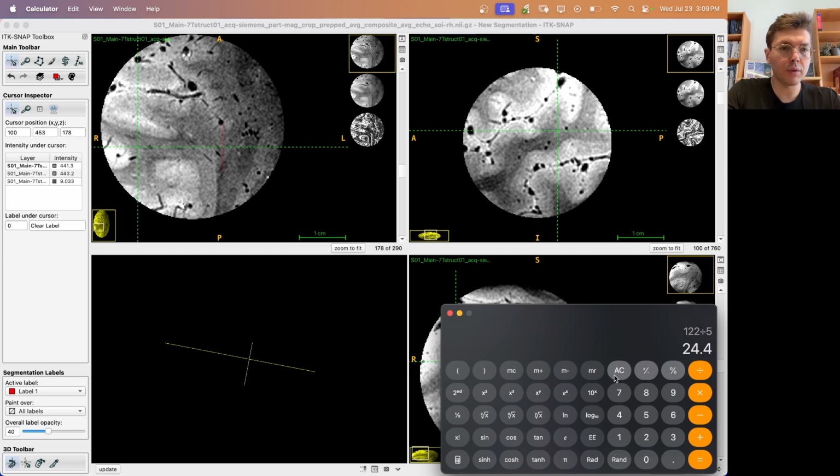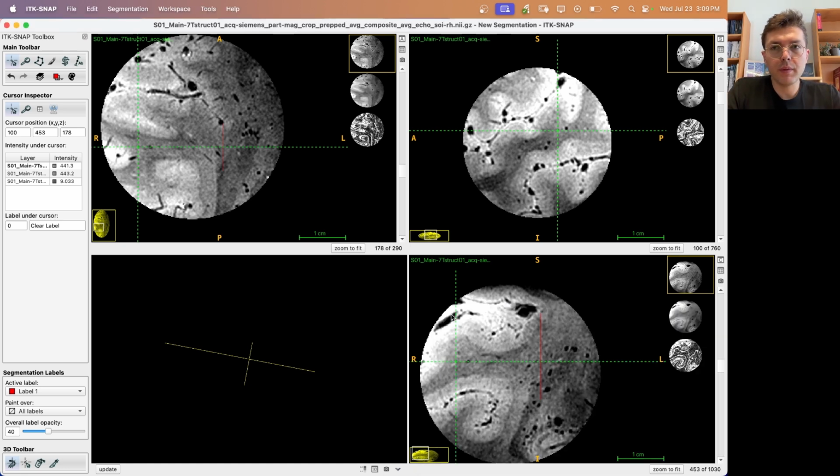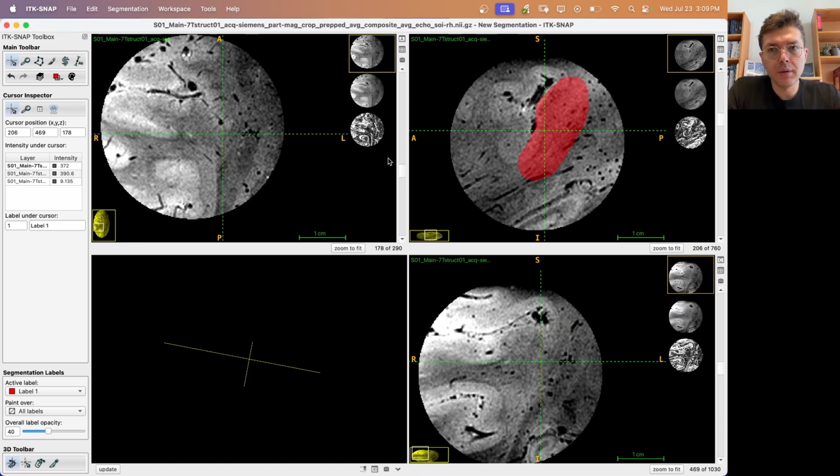If we segment every seventh slice, I go with odd numbers for a reason, like either 3, 5, or 7, because of the next step that I'm planning to follow up on this one. So 122 divided by 7 is 17, like 18 slices, which is pretty manageable. Which means that you need to do this drawing work 18 times. Okay, now this is what I mean.